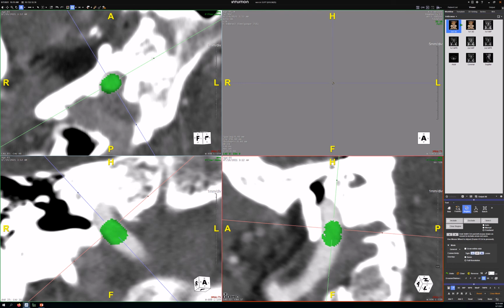So that's a little gap in our segmentation. We're missing a voxel there. You can fix that by doing it with the region of interest. Click that, and if you hold down Shift and just make sure, how far out am I supposed to go? Would this much be good? Try to do right at the edge between the tiny little bit of fat or connective tissue and the vessel. Right there was good. You want to get those, there are 2 voxels there to pick up.